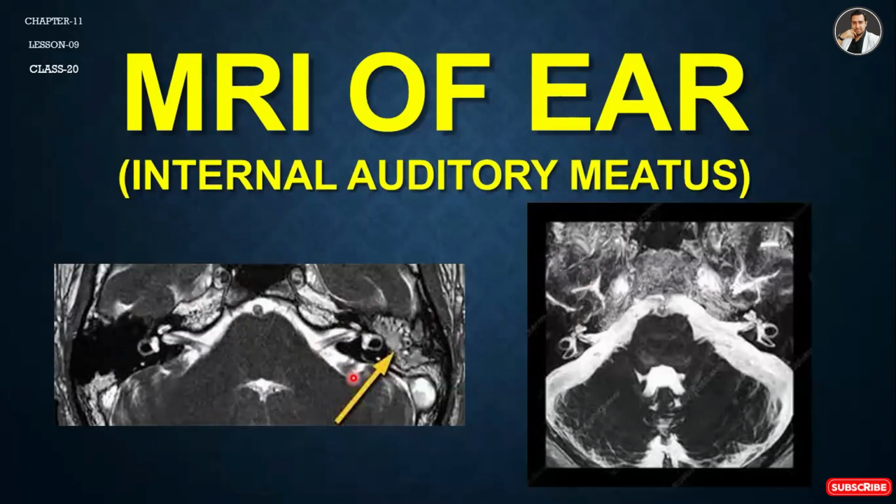The first picture is 2D. The second picture is 3D. We can rotate the 3D picture in various angles. Let's start the analysis.